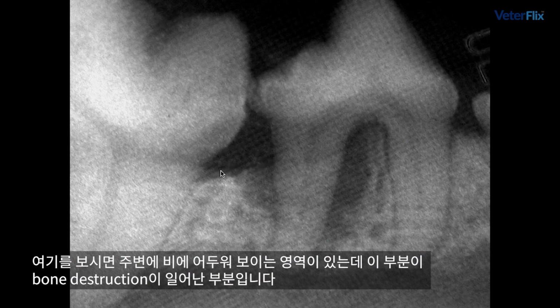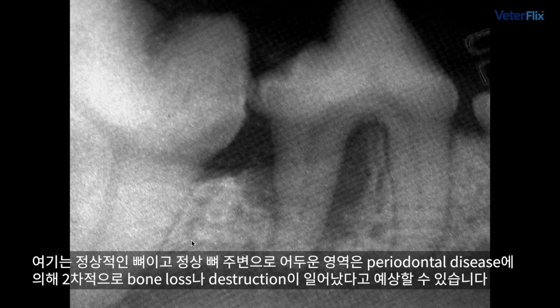All of this area that you see here that's darker than the surrounding area is where the bone has been destroyed. This is somewhat normal bone here, and when we look at a darker area adjacent to that normal bone, we can expect that that's bone loss or the destruction of bone secondary to periodontal disease.